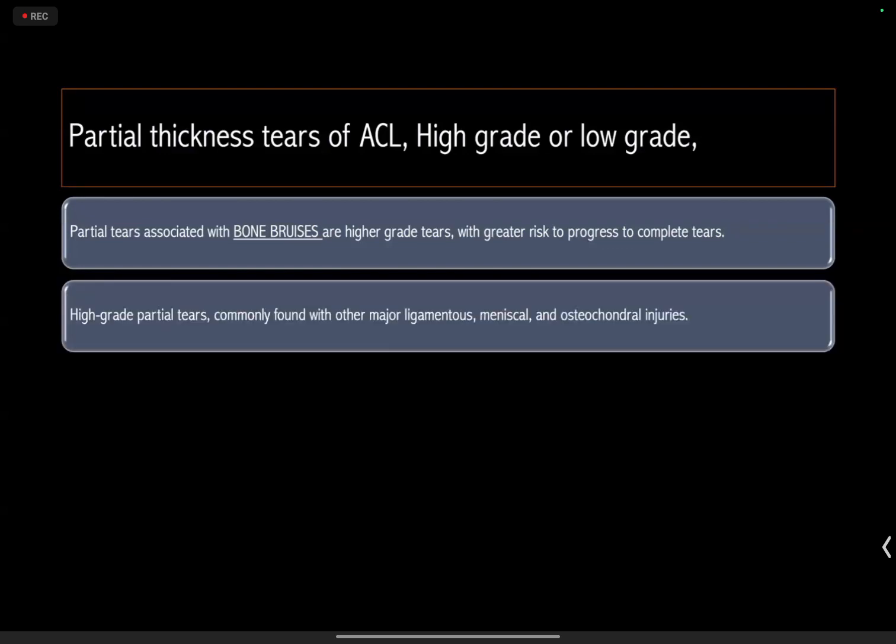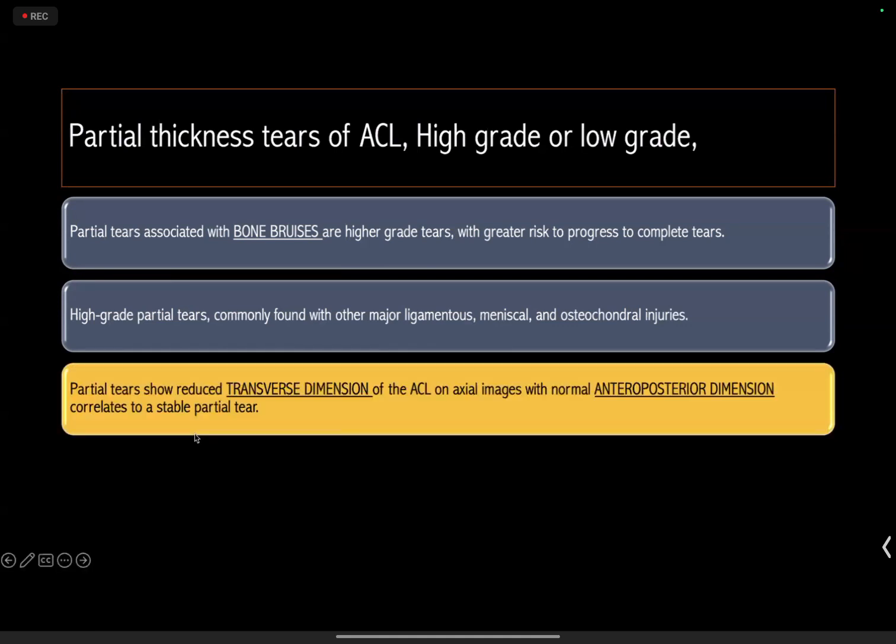High grade tear, again, if at all there are other associated injuries like meniscal tears, ligament injuries, or osteochondral fractures, then they would be again classified, or they would be having those categorical classifications towards a high grade type of tears. Partial thickness tear usually can be either seen in one plane or two planes, but we should always try to see if at all we are wanting to label it as the cross sectional part.